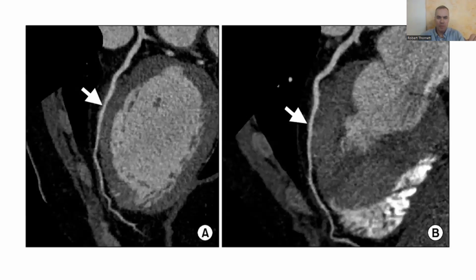So this one is pretty long. We don't know the exact length, but you can see it starts high up in the proximal area up here and goes all the way down well into the mid area. And you can see all the things that we talked about. It's narrowed. How do we know it's narrowed? Because look, it comes down like this and it gets right in here. It gets really narrow and then it actually gets wider later. That's a telltale sign if it's wider after the bridge, right? If it's wider down here than it is in the bridge, it should be the opposite, right?